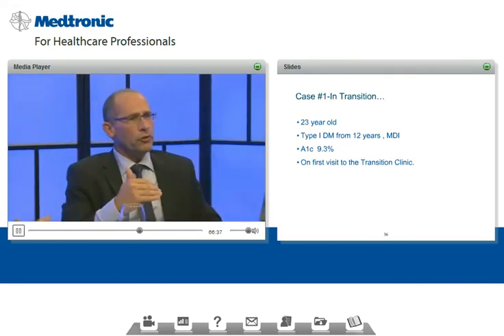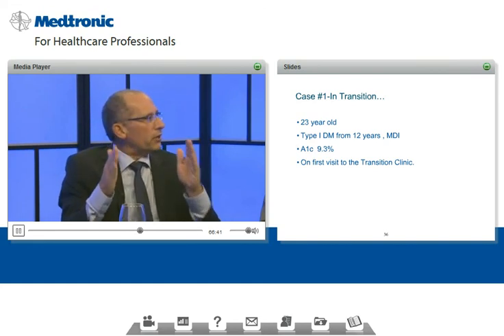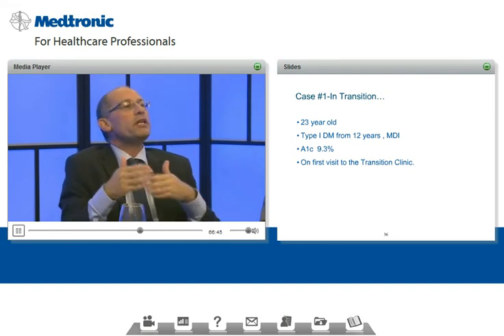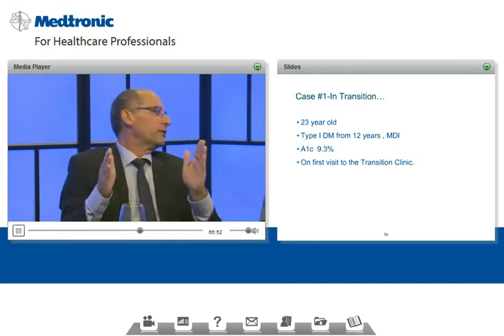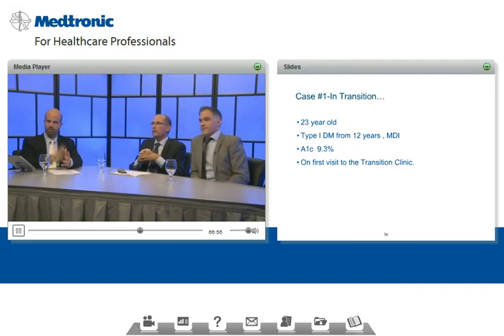So I will continue this thought, and using the downloads, it can also pinpoint the area of discussion. Right. It's lunch. It's the post-lunch. We have many solutions to this issue. We'll try one solution, but then it helps us to focus on the problem at hand, on a specific time of the day. So we'll go ahead and see how it goes.